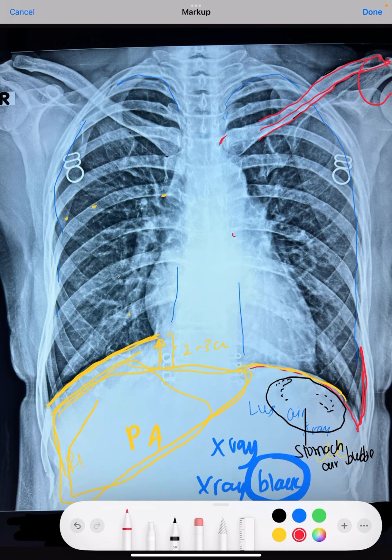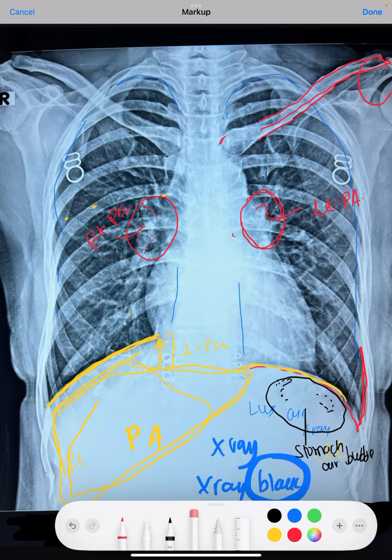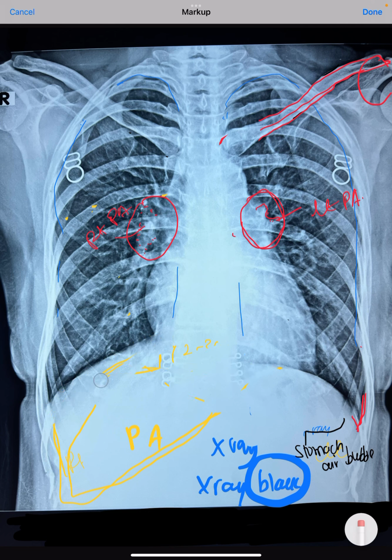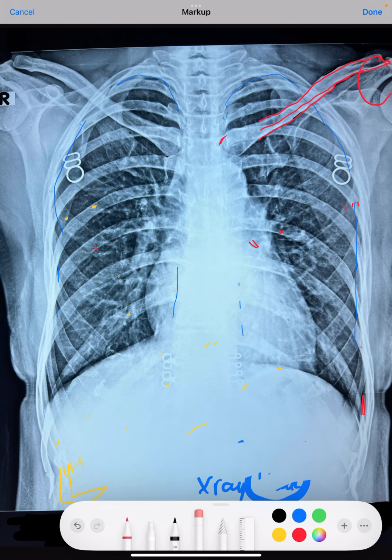You can see the right, this is hilum area. This is the hilum area because we can very crystal clearly see this pulmonary artery on the right side as well as on the left side. This is pulmonary artery on the left side. This is pulmonary artery on the right side. These are very important because these are hilar structures. Apart from that, what other structure you need to remember? Those things which you must know is the aortic knuckle. So we can very crystal clearly see that this is aorta.